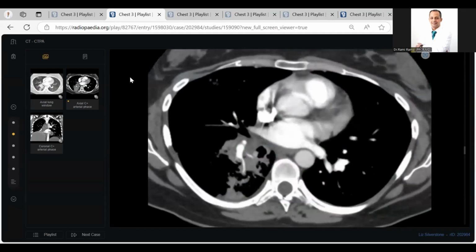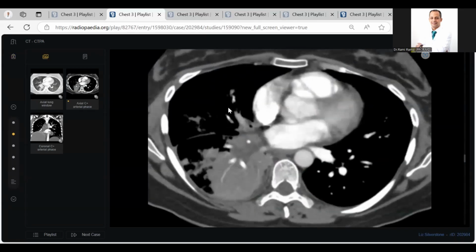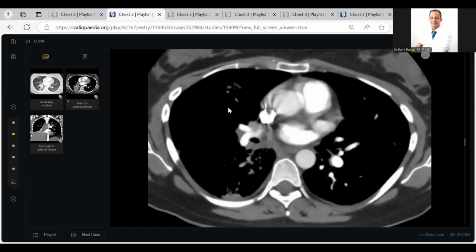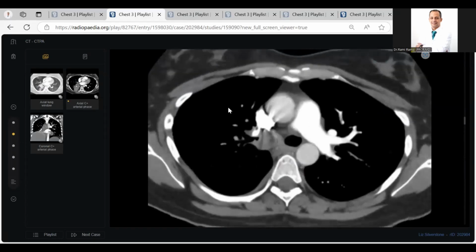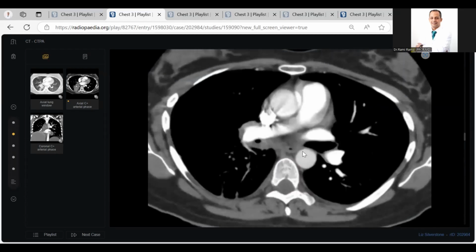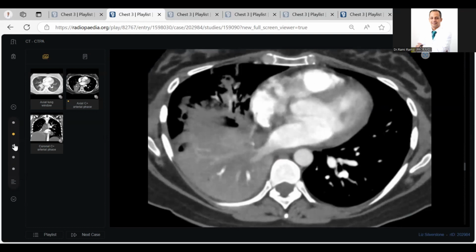And because the patient is still young, see, a female patient of 35, the first differential diagnosis is carcinoid. This one. I think I mentioned there is something obstructing here. So, I think this is a carcinoid with collapsed lower lobe.